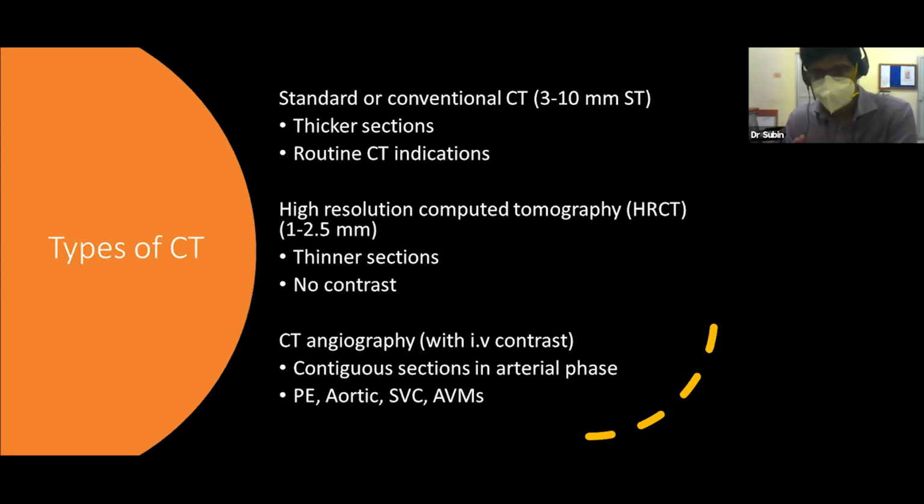The thing is that this 3 to 10 millimeter is all reconstructed images right now. For example, the CT machine that we have in room 22, the minimal slice thickness you can get is 0.625. So the machine automatically takes images at 0.625 resolution, and we reconstruct it and send it as 2 millimeter or 2.5 millimeter, or HRCT sections, which might be thinner, 1.5 millimeter, or you can take thicker sections. So the computer will reconstruct the images and send them.